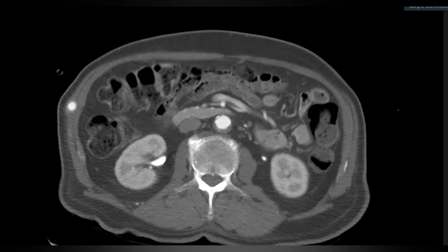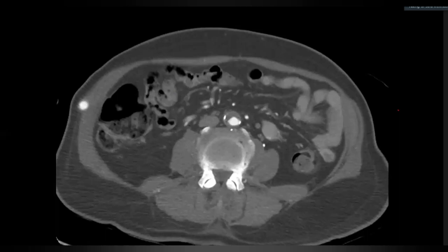And sir, I'm not sure. I would like to review the rest of the images to see what it is. All right. It might be calcification, but its density is equal to that of the contrast. Okay. And so also I would like to review the plain images to confirm.